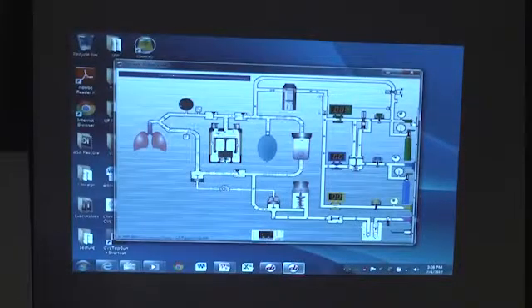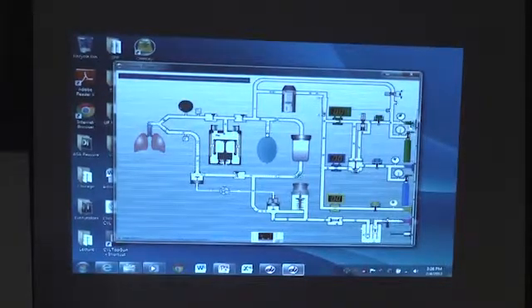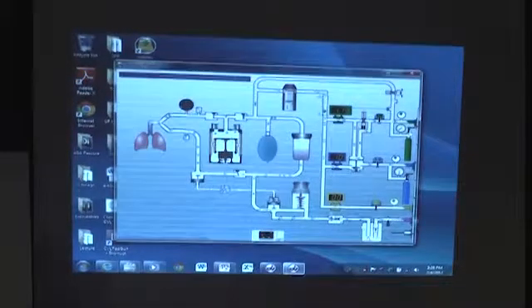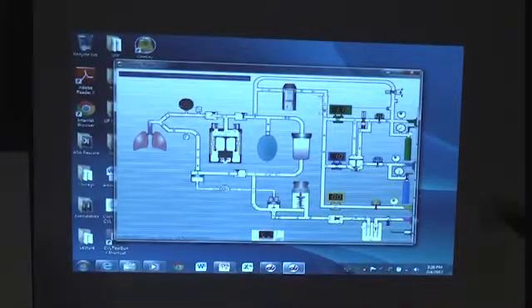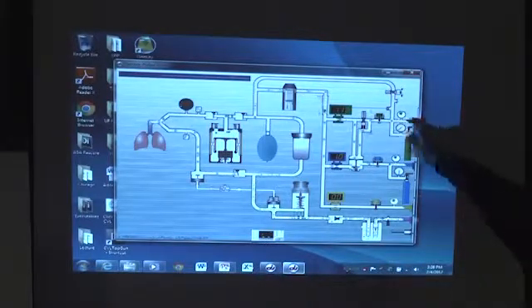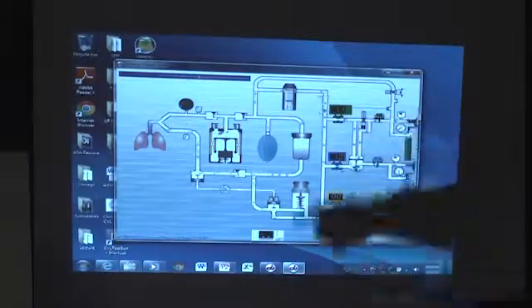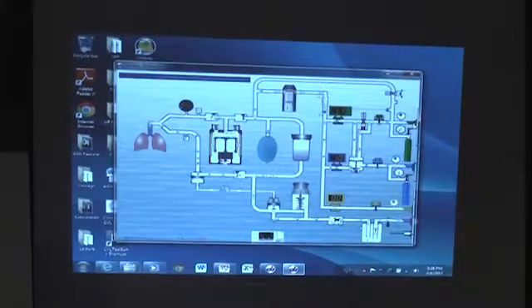And then lastly, you can also see that if I put this back, and I open my cylinder, same as in the other design, the gas is still coming out of the pipeline. And that would be the bad gas, right, if this was misfilled. So nothing will happen until I do this.